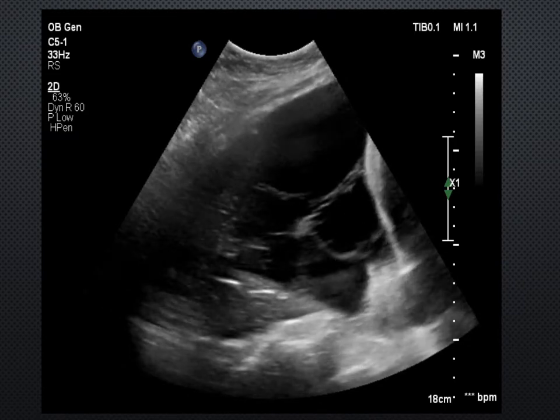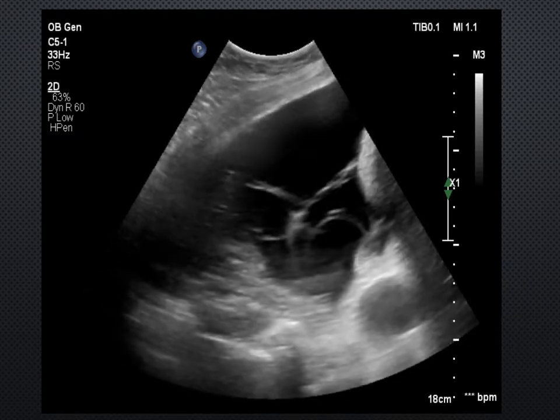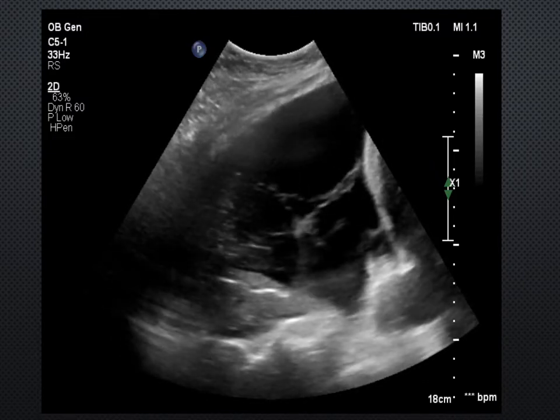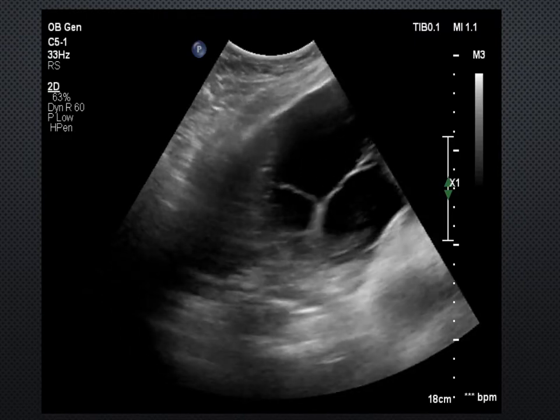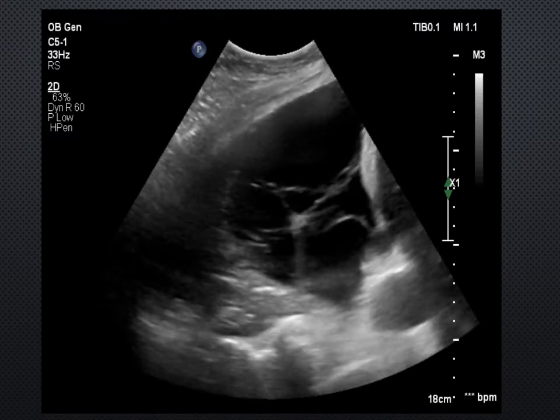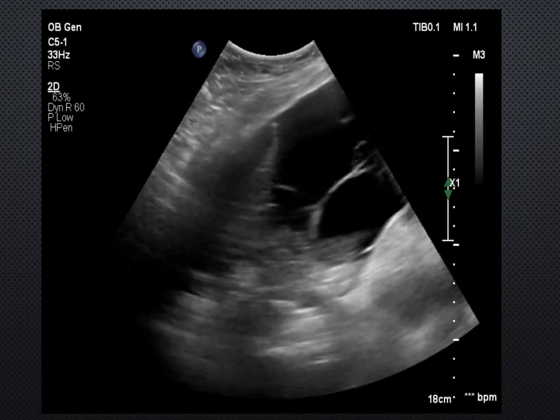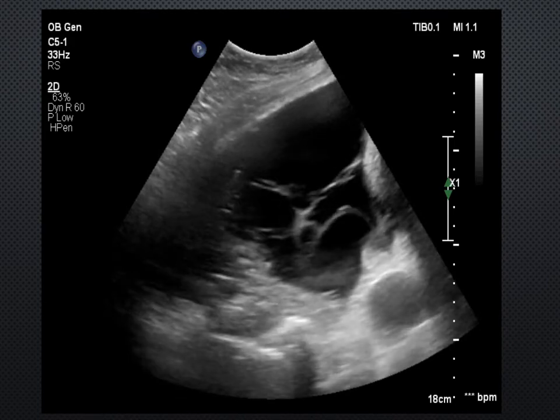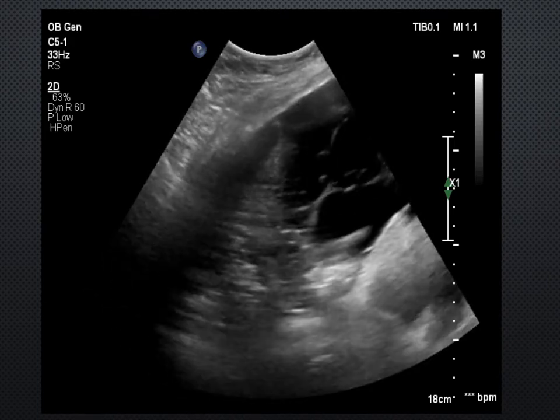So progressing on from some of the images that we were seeing before, where we've got more of a protein-rich or a more viscous type of solution within that thoracic cavity, well, we might find that over time that starts to develop into more of an organized septated type of effusion that can cause some complications in the long term for the patients.